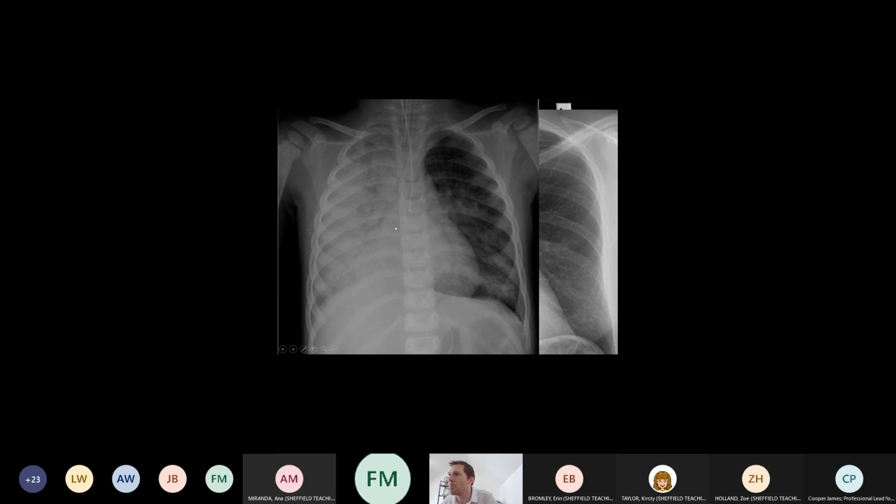So this might look like a pretty scary chest X-ray, and you might think, oh, how do I start interpreting this? Well, you've got your answer straight away. You've got air bronchograms. This is consolidation, probably due to fluid within the alveoli. Again, on this left-hand side, it's not as bad as the right, but you've got this patchy, fluffy whiteness, cotton wool type appearance. Again, we've got consolidation in the left mid zone and the left lower zone as well.